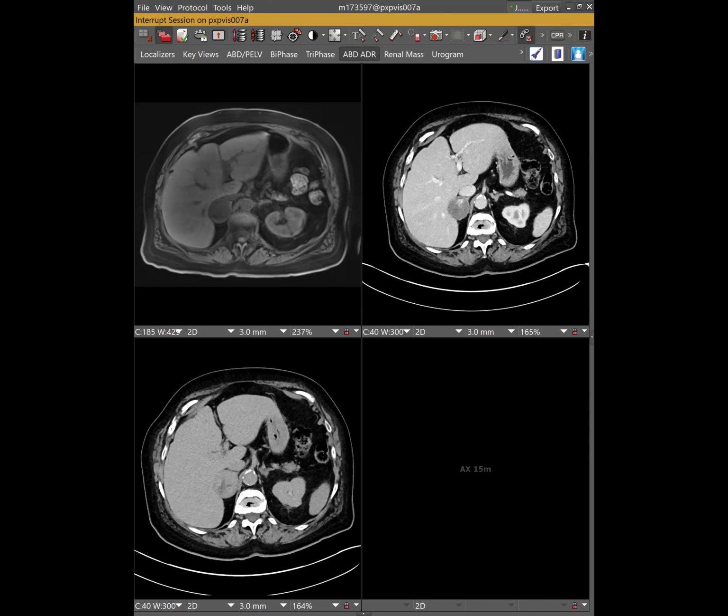But in this case, the T2 was bright, right? If it's a very chronic hematoma, T2 should be dark as well. Oh yeah, it was super bright. But then if it's more acute, the T1 should be bright. I don't know. I think it's a chronic hematoma with chronic bleeding. Yeah. The path said specifically that there are no viable cells within the entire lesion. It was just hematoma.